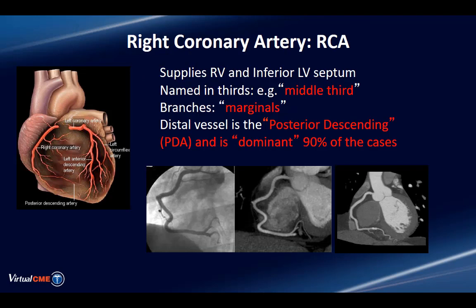The right coronary artery I'll bring up next, and this is actually the first of the circumferential vessels. This travels in a perpendicular plane to the descending vessels. And most of the time, the right coronary artery is considered a dominant vessel because in its 3/3, proximal, middle, distal thirds, as it travels in the AV groove, ultimately it hits the interventricular groove on the bottom of the heart and gives rise to a posterior descending vessel. That vessel may be large or it may be small, but it typically does provide some septal perforating vessels to the inferior septal wall of the left ventricle.